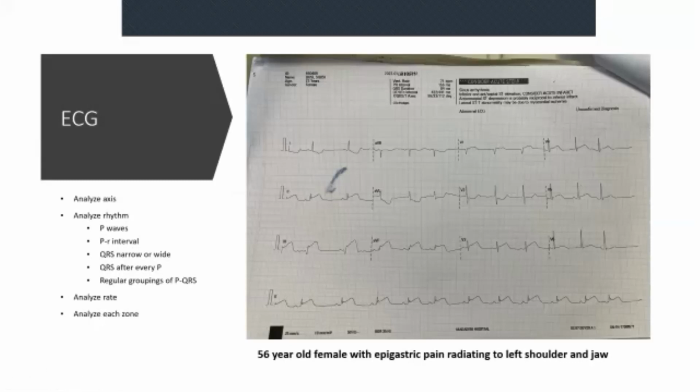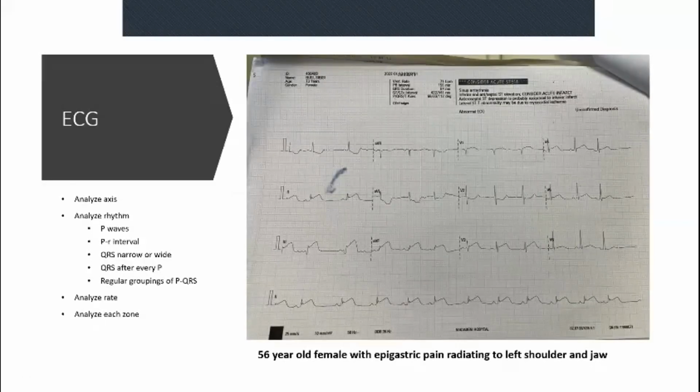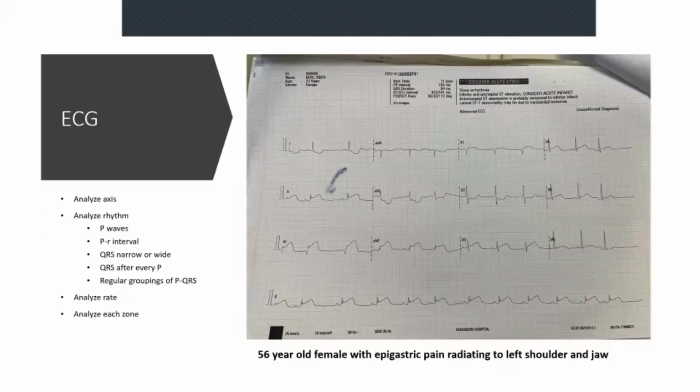Now this is actually a patient that we, is it, it's not displaying properly over there. Okay, well, I'm going to give you all the enlarged version just now. And if you're having trouble seeing it, you're more than welcome to come in. Let's have a look at it there. Okay, so you can also have a look at it with me over here.